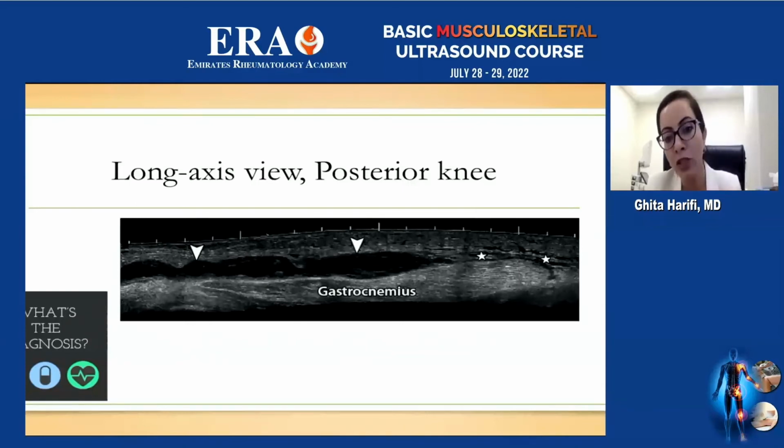So this patient can present in a few days not with knee pain, but with leg pain and a swollen leg that can sometimes be mistaken for DVT, in view of the pain, the swelling and the clinical aspect. But ultrasonography can help you identify extravasation and Baker cyst rupture in these cases.